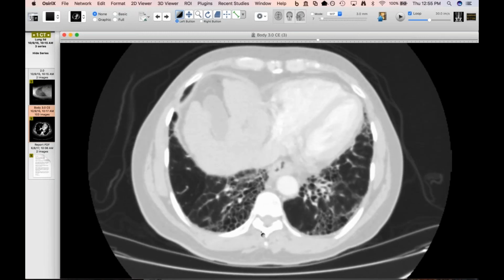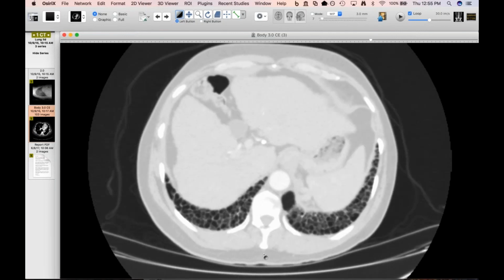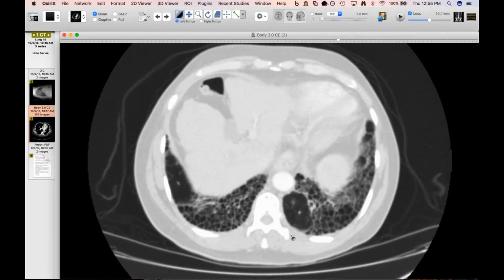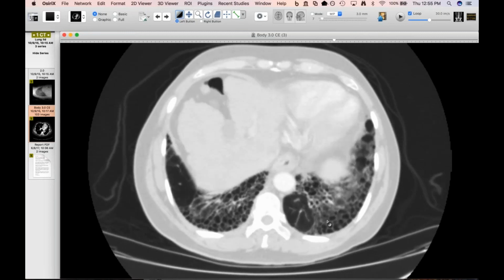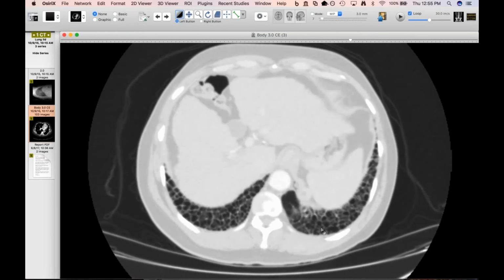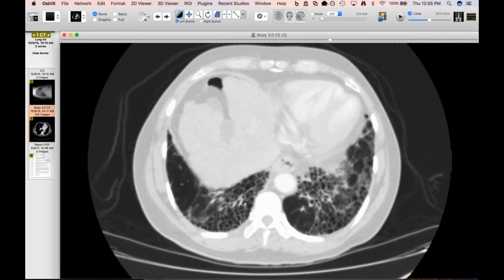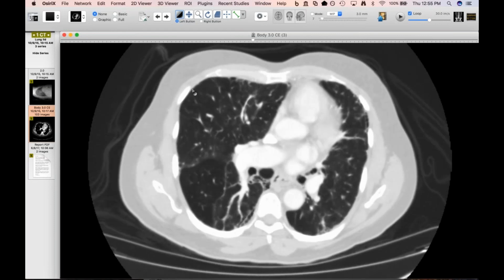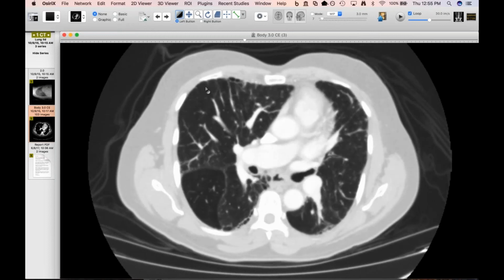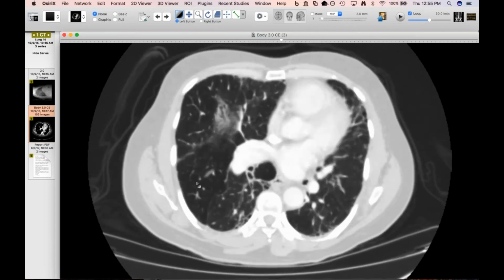And these are the ones, and I know, David, I think Jeff had tried to coin it as champagne lung or something, where you have all of these cysts that mimic honeycombing. But if you look here, it's not just traction, because you can follow the airways out pretty far into these areas, and it looks like the airways are just surrounded with cysts. And the other thing that isn't great for a classic UIP IPF is that the remainder of the lung is completely normal. There's no reticulation in the other areas at all.